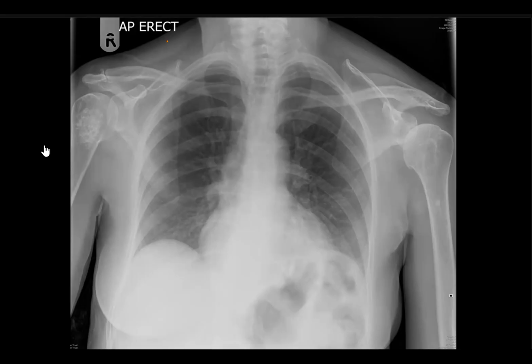Coming back towards the right arm, I would like to keep the differential of some chondroid lesions. First is chondroid lesion, second can be metastatic deposit. Metastasis like this is unlikely, basically unlikely. They are deceiving you by the breast shadow.